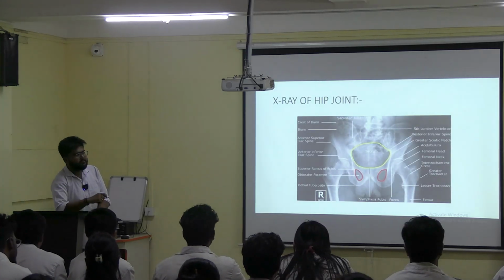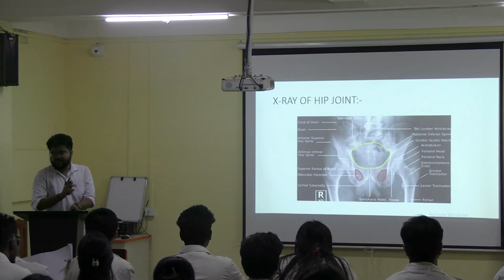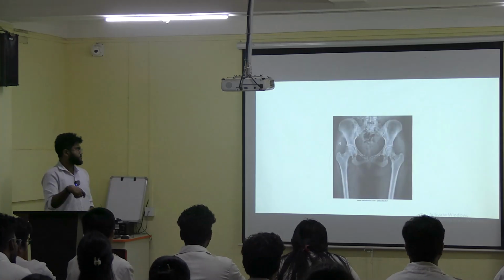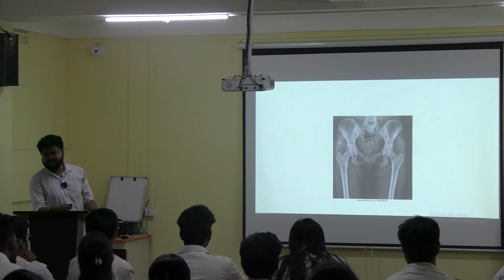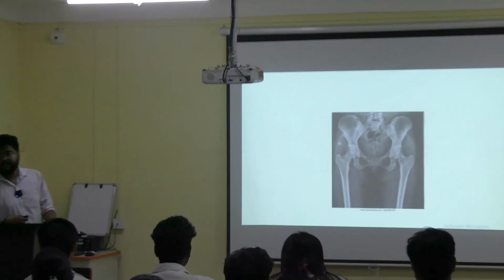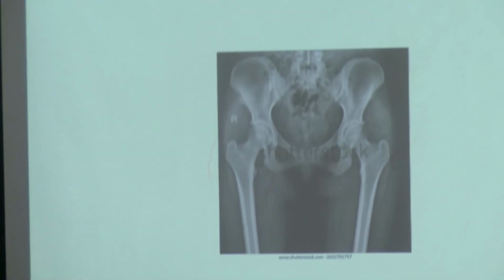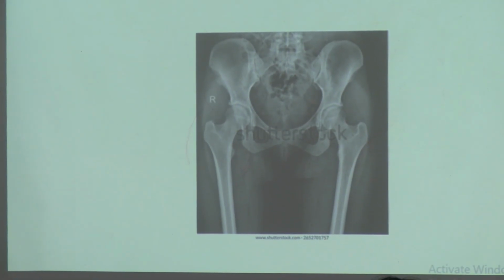So just a recap, in the hip, only three X-rays are present, but in the exam these are also given. We collect and give these X-rays. These X-rays are very important. So first, here is how you should describe this X-ray. This is the X-ray of the pelvis, AP view, showing the hip bone, the femur bone, the vertebra, and the sacrum bone. And the joints are present.